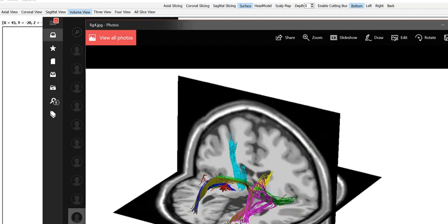Then we can also link that to a particular diffusion tensor imaging based upon the DTI, diffusion tensor imaging atlases. Right now we're working with one particular one, but the Catani and Thiebaut de Schotten atlas is an example of a very good diffusion tensor imaging atlas. But the important thing is that we eventually will be able to add diffusion tensor imaging to give a different perspective, a structural relationship of the white matter with endpoints being the sources of the current density in the cortex, both in raw scores and with z-scores.